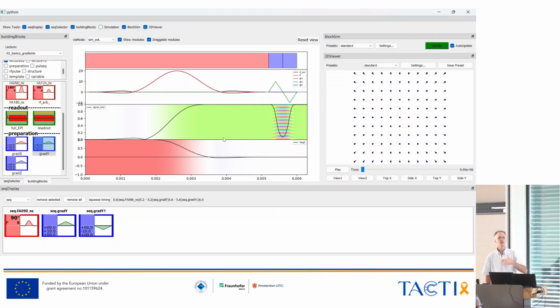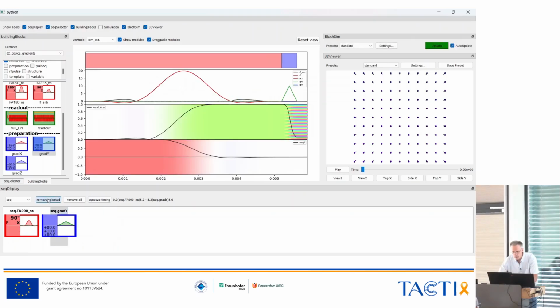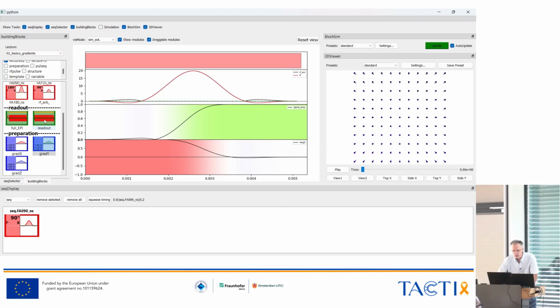Yeah, so they imprint a spatial pattern based on that. And we can actually make use of this to do imaging. So at this point, we won't go too much into details. You can just move this image readout over.